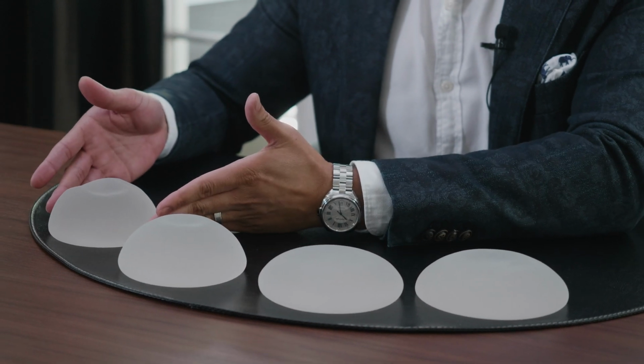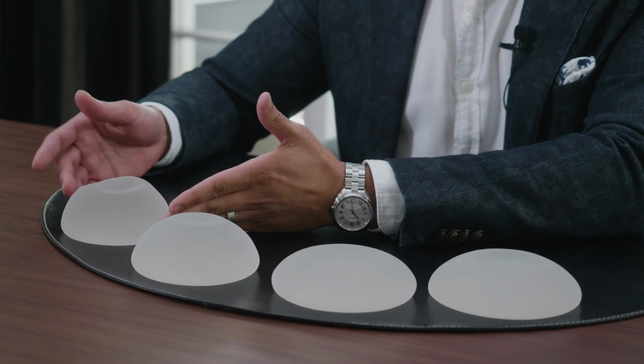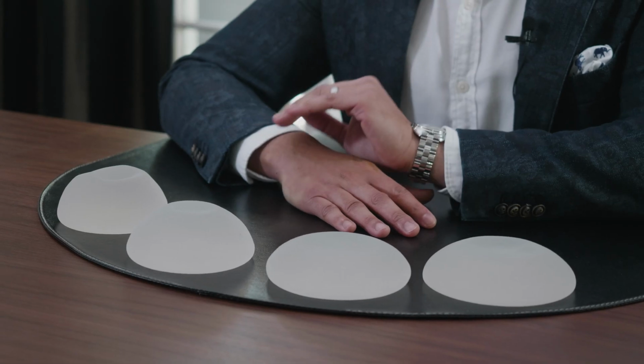And we need a base width that falls in under that 13 centimeters, generally around 12 centimeters, because we do need to give a little bit of room for the implant to sit in. We can't go directly to 13 centimeters. You have to think about skin, fat, and other tissue that's there. So the main risk of going too wide with an implant is having the implants sit very far out under the armpit and also pushing this way and connecting the breast. So that's what we call symastia or uniboob.